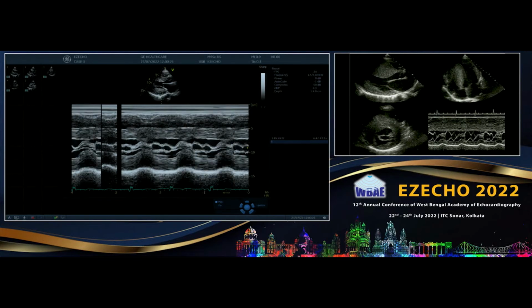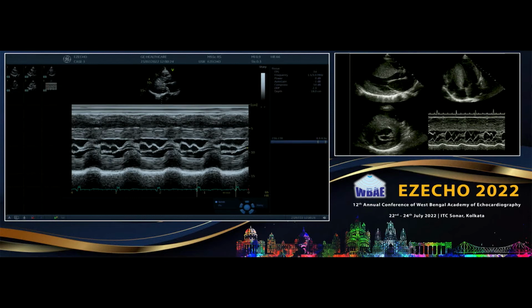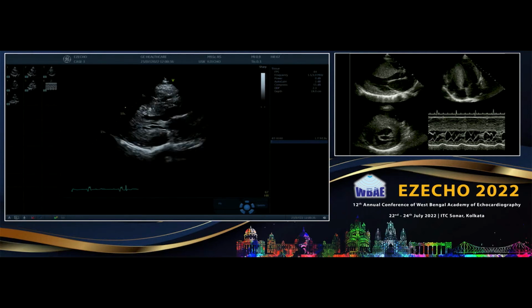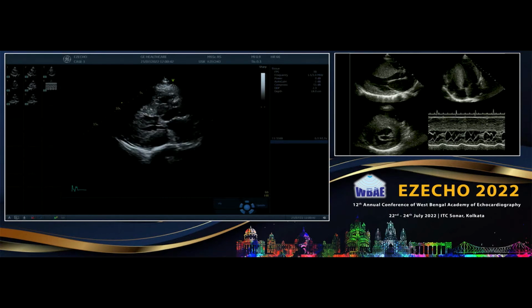It's a very interesting thing, because we have to look at the risk factors of this particular patient. Just looking at it, we know that there is a hypertrophy and there is a systolic anterior motion, correct? So first, what we would advise is to look at this SAM on the M mode.